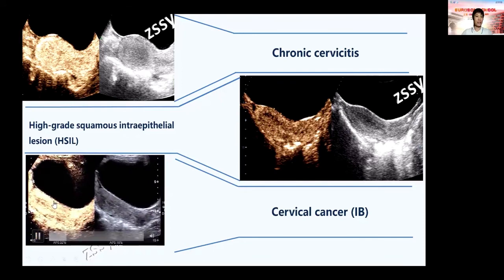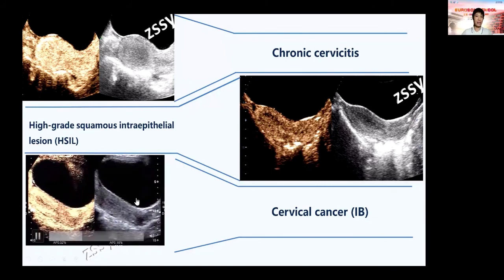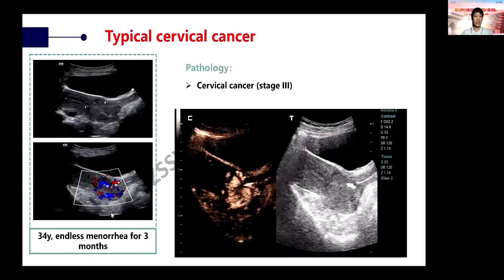It's earlier than that of the myometrium and the rest cervical area. Compared with case D and case E, we found that the difference is that there is a hyper-enhanced tumor in cervix. Pathological result confirmed again the CEUS image.